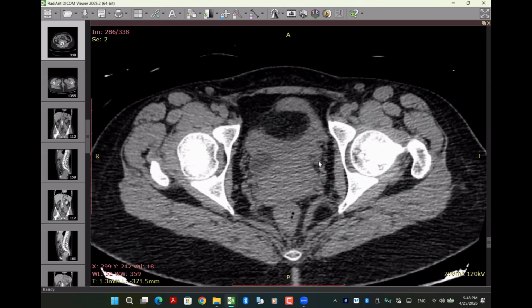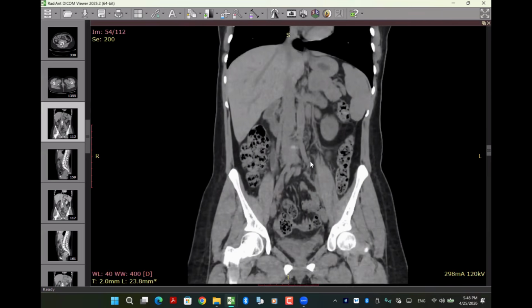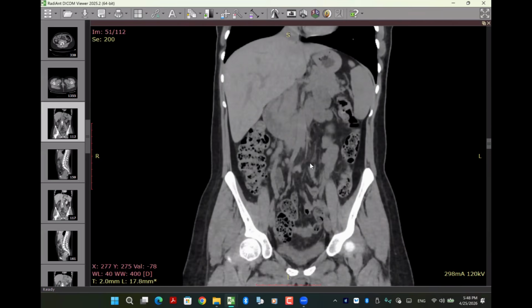The ureter, which appears to be in the distal end, appears to be sometimes elongated. So this could represent ureterocele. Post-contrast images are advised. Just a second, let me check first. You ask me for the coronal. Scroll the coronal. Yeah, on the coronal images.